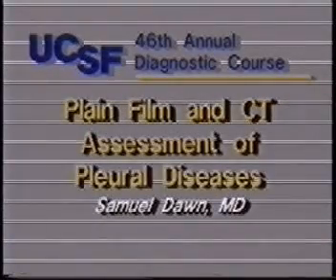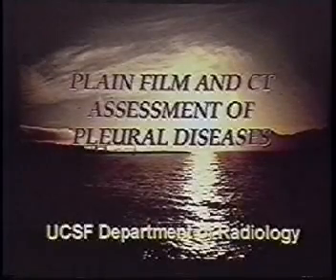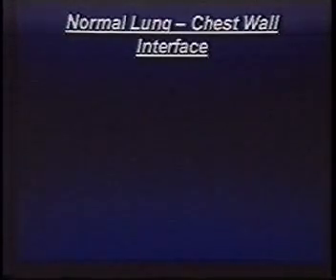Plain radiography and CT remain the mainstay diagnostic modalities for the assessment of the pleura, and I will be speaking today in the context of these two modalities. First, I'd like to begin with a brief overview of the anatomy at the normal lung and chest wall interface.